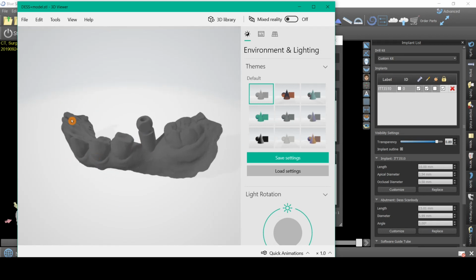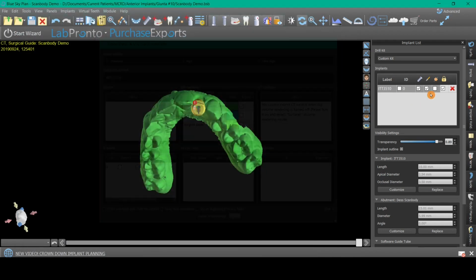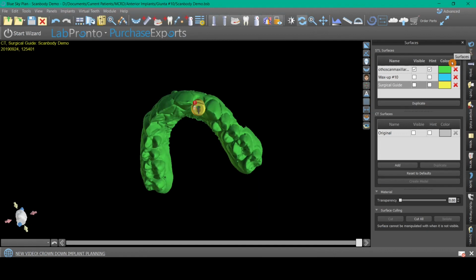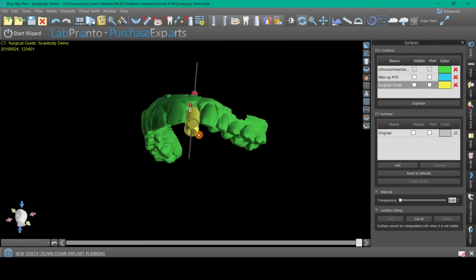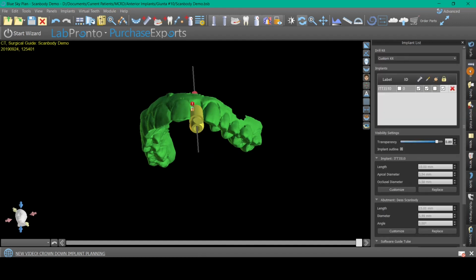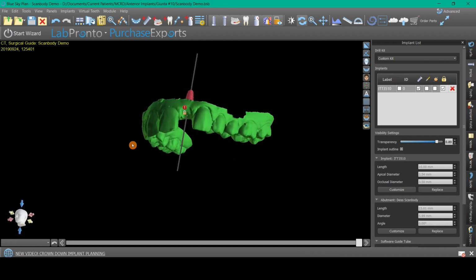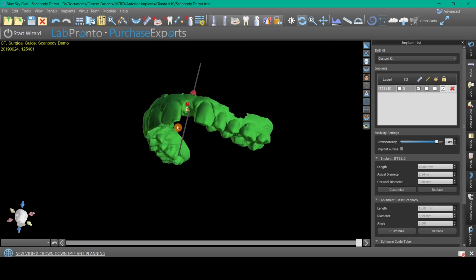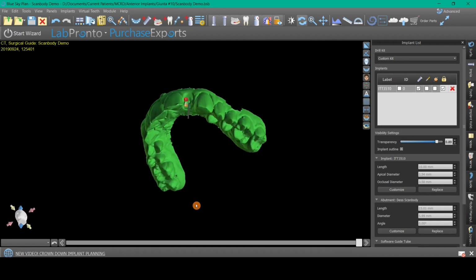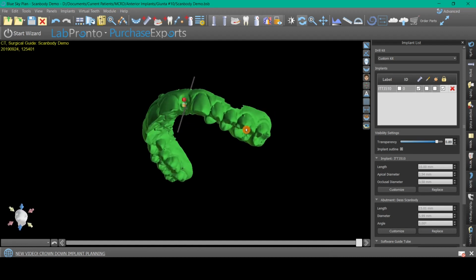So this image gets sent to the lab along with, let me cancel this out real fast. So these are the two files that I'll send. I'll send this exported STL file, and we'll also send this exported STL file, which is essentially the patient's original scan, or perhaps with the tooth digitally removed. And then we'll of course send the lab the lower jaw, or the antagonist.